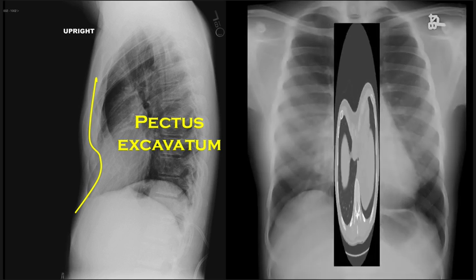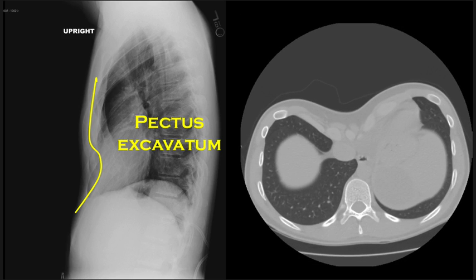I say, like, well, why is that? Well, when you've got a depressed sternum like that, it pushes the heart posterior into the left, and it also creates a bunched up appearance of those soft tissues there in front of the chest wall, and those things together create the appearance of increased density, which is what mimics that right middle lobe pneumonia.